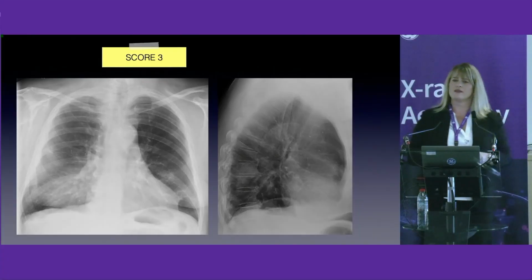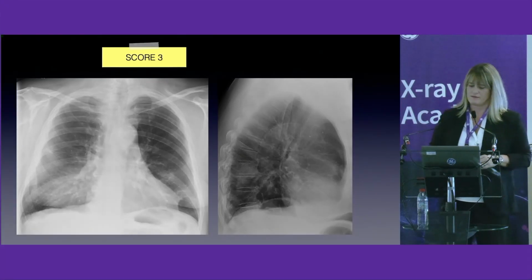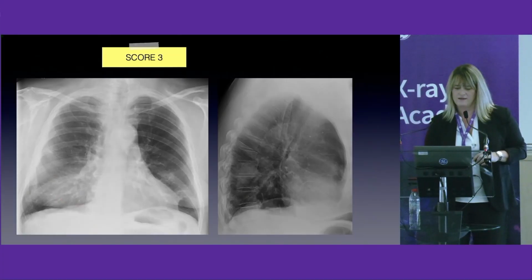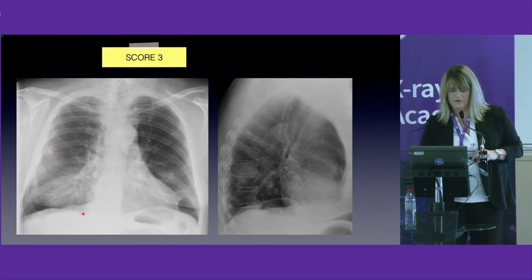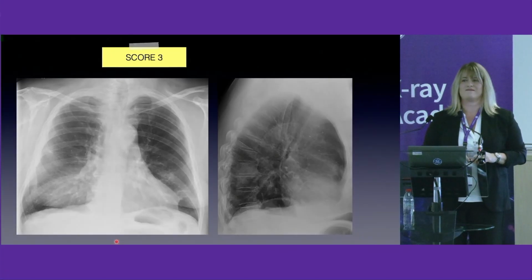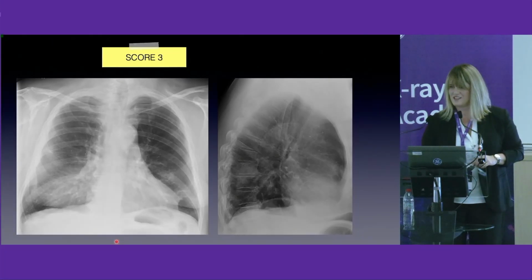Is there anything wrong with this? You have two projections here. Two opacities. So I think here and here. In the middle. Okay. Anyone can see anything in the lateral projection? Yes. It's very important, the lateral projection. Here, you mean here. Okay.